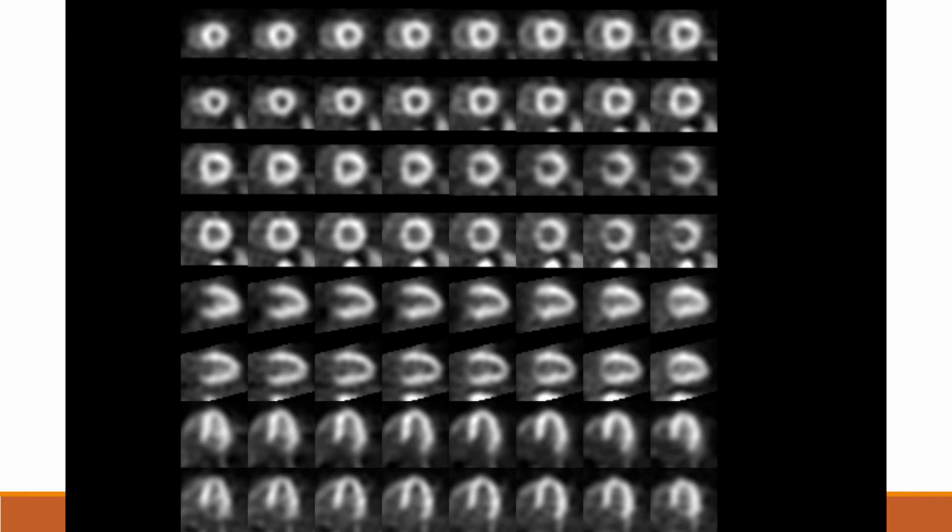Once the study has been determined to be of high quality, we can proceed with the interpretation. A good quality PET perfusion study, absent of any perfusion defects, should appear uniform throughout the entire myocardium. The only remaining fluctuations should be from partial volume artifacts at the apex, the papillary muscles, and at the intersection between the LV and the RV.